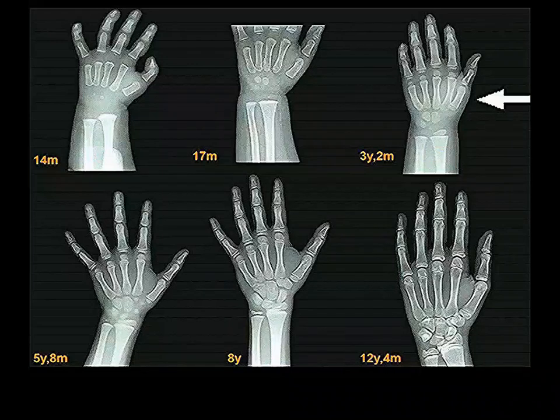Here it's very clear the distal epiphyses for the metacarpals, except for the first metacarpal, which ossifies like a phalanx does. So it has a proximal epiphysis. All the phalanges have proximal epiphyses. Metacarpals have distal epiphyses, except for the first metacarpal, which has a proximal epiphysis.